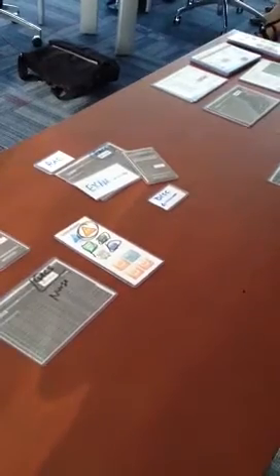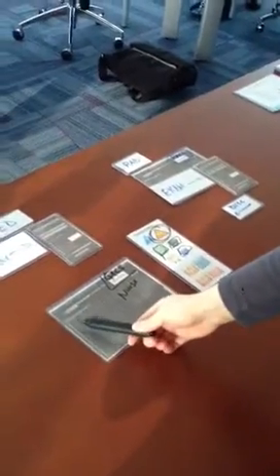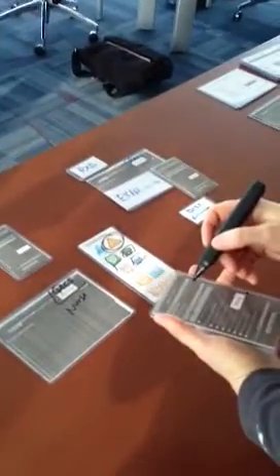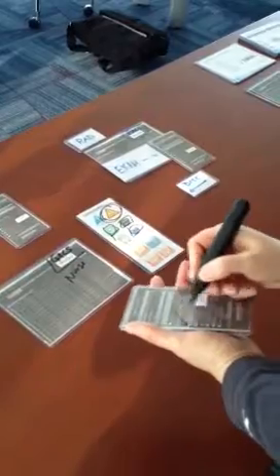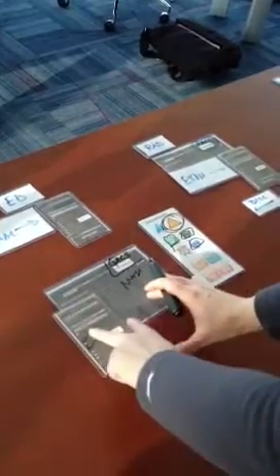From that point, a number of things can happen. So we can customize this any way we want. What can happen is that nurse can use this work list as a way to ensure that they've communicated, to follow up on these, and we could create a custom panel that could say anything you want to communicate to any of these patients. Perhaps they need to be brought back in or some action needs to be taken. So these pieces of information can be recorded in a customizable panel for you, and the nurse can submit and follow up on those actions.